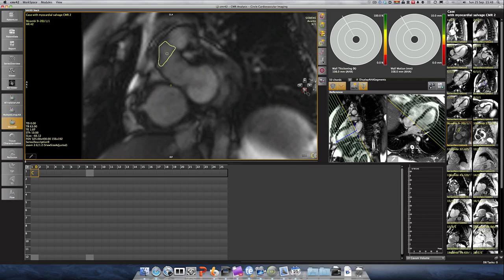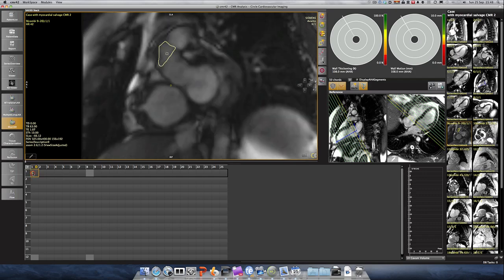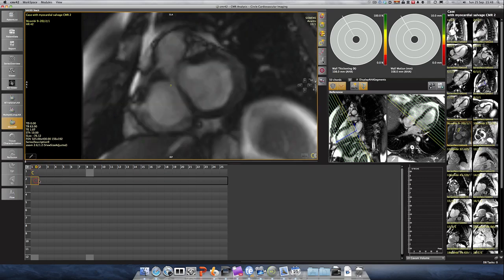If I now go one slice down, it becomes a little bit more tricky. Probably have the aorta here with the right coronary artery coming out. So that's the aorta. But maybe on top of that, we've got the outflow tract again. So what you also need to remember, if you choose and you're confident that this part one further up is RVOT, which maybe I actually now revise this and I'm not. But then you can't possibly then say this is all aorta, because once you've said that this is a basal slice, then this also needs to include some RV.